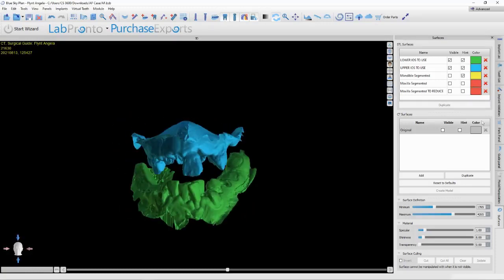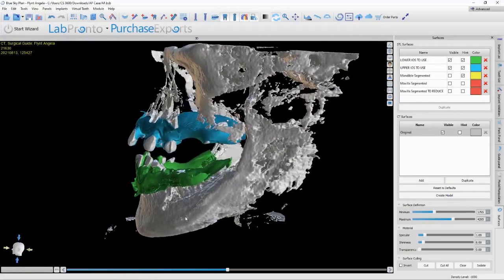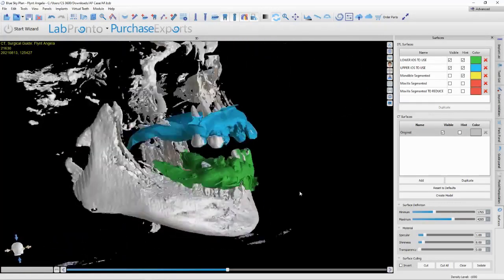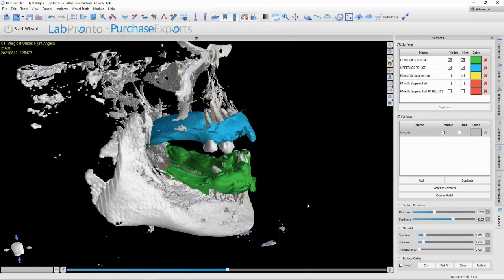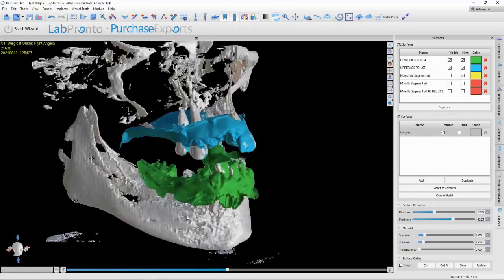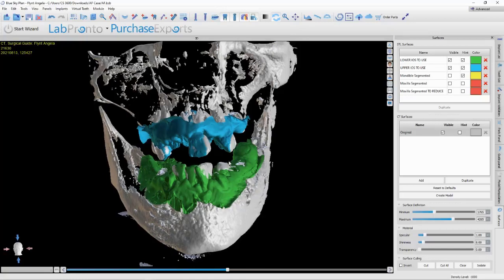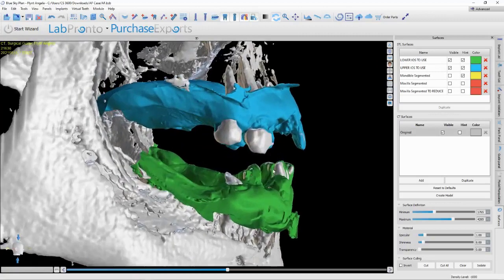Alright, now bear in mind, if we went back and did this again, you really should be cone beam scanning patients for full mouths in occlusion at the correct VDO. Now she was a little collapsed. I would have just used a leaf gauge and opened her to the right facial proportions, and then holding her in that position in occlusion, I would have taken the cone beam there. And the reason for that is here you can see she was taken in an open bite.